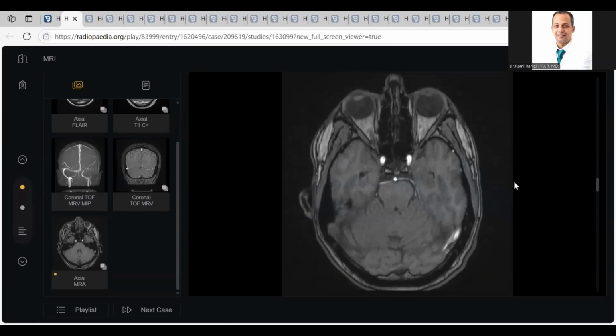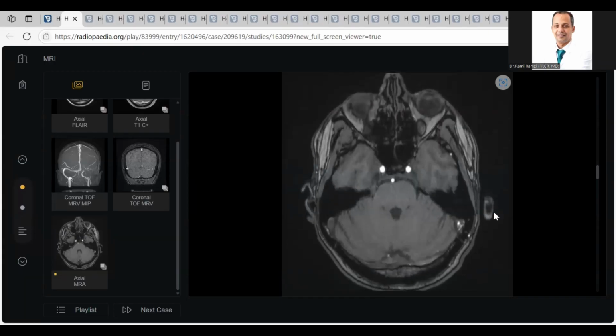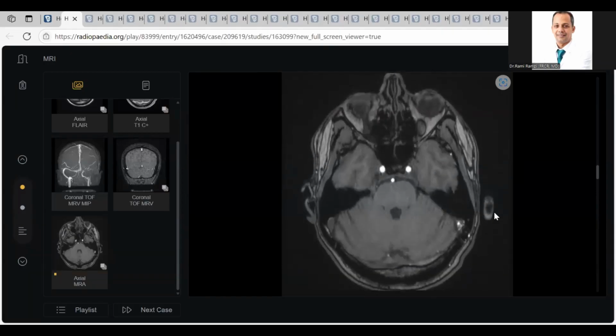No. See, we are acquiring an arterial phase. During this, we saw the transverse sinus. But you tell me what happened. Why is the transverse sinus seen during the arterial phase or during MRA? So this could be due to fistulous communication. Excellent. Thank you.